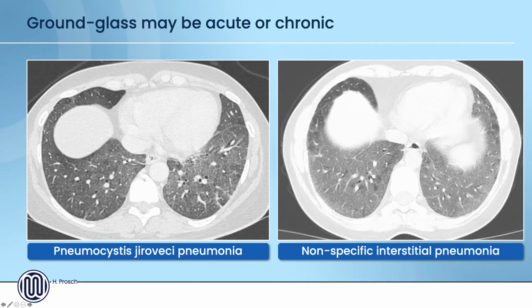In fact, this pathology is primarily seen in the alveolar spaces, whereas here this is non-specific interstitial pneumonia in a patient a few days prior to lung transplantation. This is an interstitial process, but it gives you just the impression of reticular abnormality or ground glass. So ground glass itself should raise the suspicion that you're dealing with a fibrosing lung disease, but that's not enough. You have to do more. And the same, but not to the same extent, holds true for reticular abnormalities.